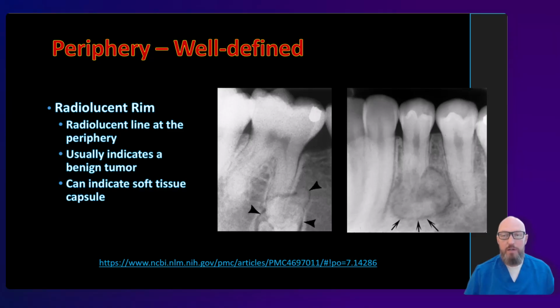There are 3 types of osseous dysplasia. There's also ossifying fibroma, osteoid osteoma, osteoblastoma, odontoma, and cementoblastoma. The 2 examples in this case, this is an odontoma, and this is a cementoblastoma. And I'll do a whole segment on these lesions, the radiopacities with radiolucent rims, and I come up with acronyms for each of the differentials.